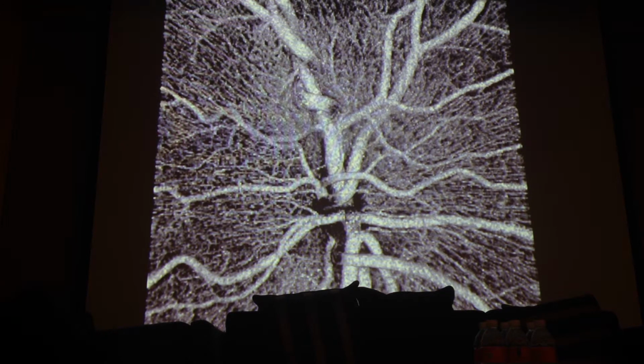Another step you have seen is increasing resolution. As the systems are more and more efficient in acquisition, in segmentation, in treatment of signal for reconstruction of the vessels, the more we increase resolution, the more we can see details, and the fewer artifacts or misreconstructions of the vessels we have.